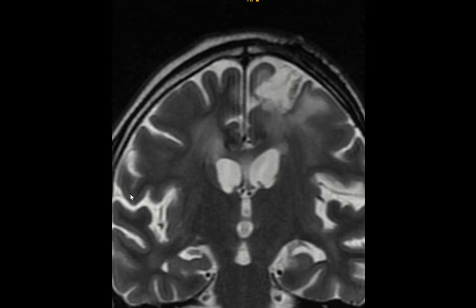Alright, so that's this case. Most likely a recurrent glioma, and looking at the cellularity, it looks like a hypercellular one. So secondary glioblastoma cannot be ruled out. That is what I would write in my diagnosis. I will call the patient for MR spectroscopy and perfusion, and will tell you how it goes. Thank you for your attention and have a nice time.